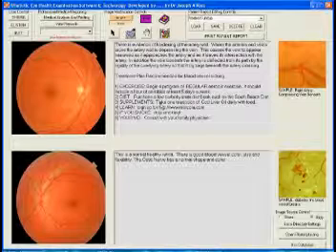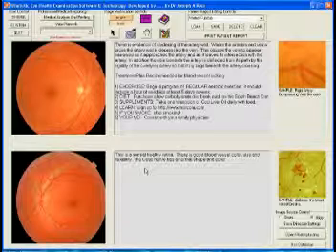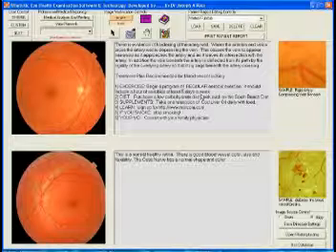We've looked at their eye health. We can tell them about drusen, how to prevent macular degeneration in the future, and they are going to love you. You're going to print a copy of this while you do the rest of your exam, so it takes no waiting time. And then you're going to put 2 copies, one for the patient in the vision report, which you should be giving them, and one for yourself. And with this report, they're going to go home, show it to their friends and family, and tell them what an incredible doctor you are, because you are, and you do deserve that recognition.